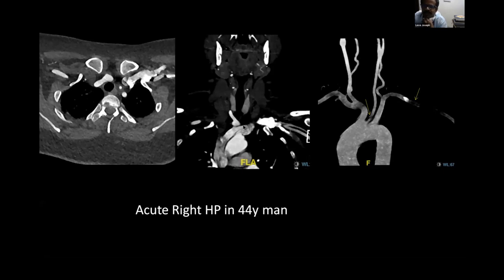In the process, the dense contrast can create streak artifacts, and you can erroneously diagnose major vessel disease. So that's why we often insist to the neurology residents, you put the cannula in the right cubital vein. Here the pathway is straight from the right brachiocephalic vein. It is a short pathway. On the other hand, here it is all across the major vessels. That's one point to be taken. Here, for a similar reason, you can see some of the vessels are missing from the arch.